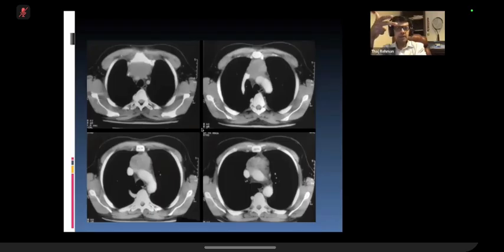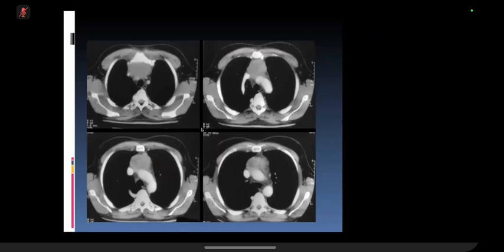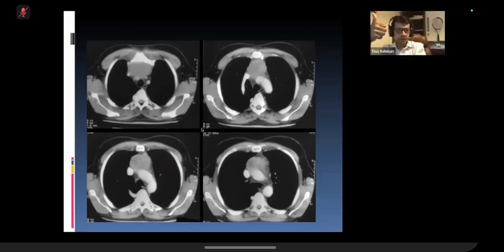As you correctly said, it's a bit unlikely to be a goiter because the epicenter of mass is quite a bit low. Number 1. Number 2, goiters have typical appearance. So realistically 2 differentials. One is a thymic tumor, and the other is a lymph nodal condition like lymphoma. Now, if you look at lymphoma, usually the lymph nodal pattern will be identifiable rather than one large single soft tissue mass. So with this one large single soft tissue mass, I would consider thymic tumor first.